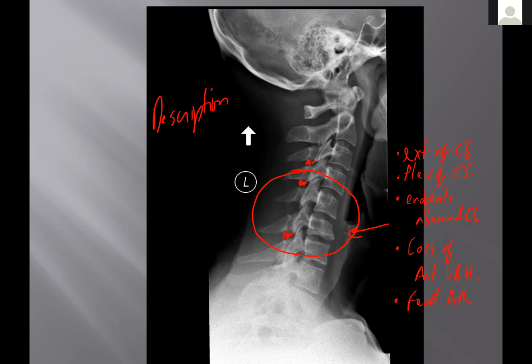At C6, what do you notice there? Wouldn't you say that it's increased, more between C4 and 5, flexion? Good. Yep, the flexion of 5-on-6, and then also, like someone said, and that's tied together, there's an increase in the interlaminar space of 5-on-6. It's wide there. But this is why I'm slowing you down. There's a wide interlaminar space.